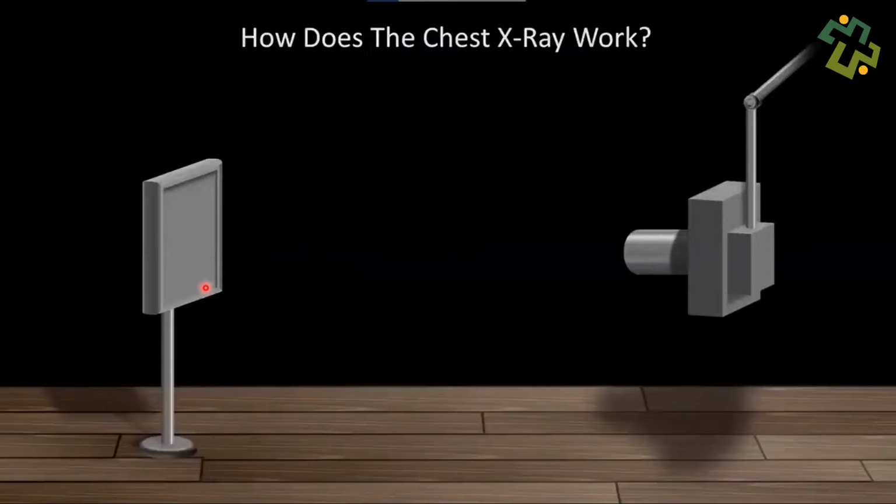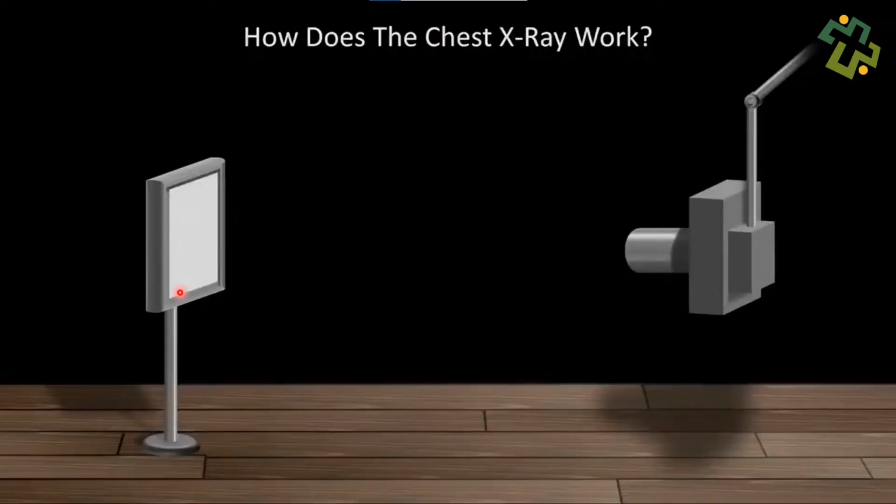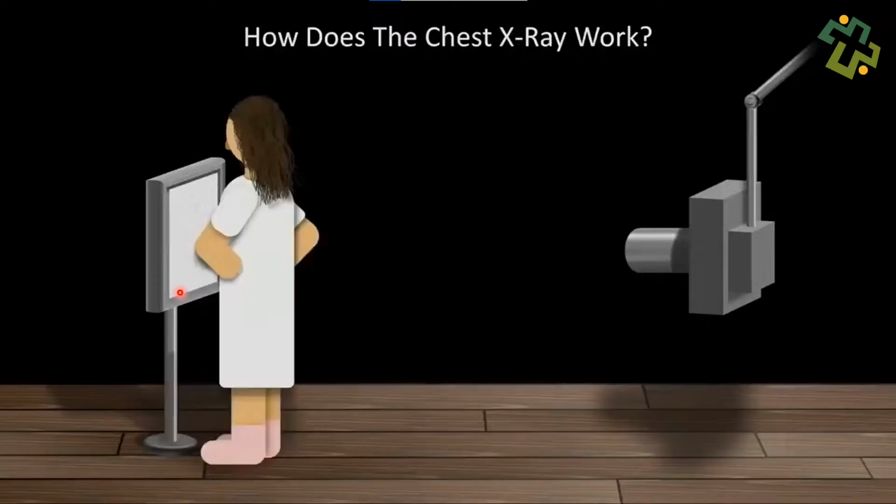There's our detector right here. Now, for the first 100 years of X-rays in medicine, the detector was just a photographic plate or film, and I will add a sheet here. So there's my sheet right here of unexposed X-ray film. Now, however, most hospitals have replaced these with digital detectors, which allow for real-time viewing, as well as improved post-exposure digital manipulation. Finally, of course, we will need our beloved patients to stand in between the source and the detector.